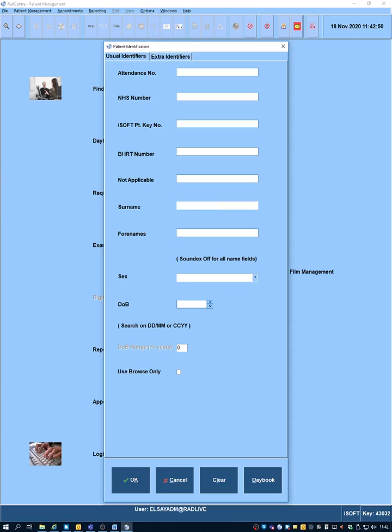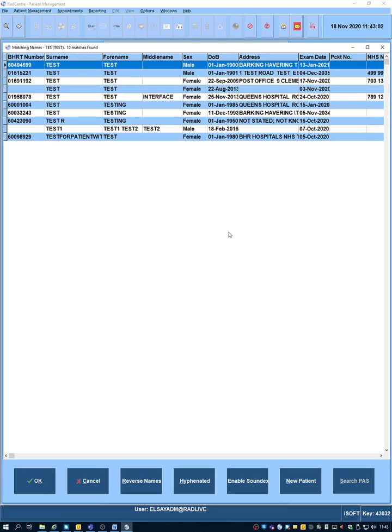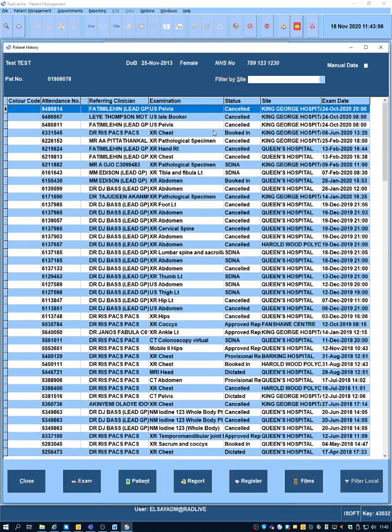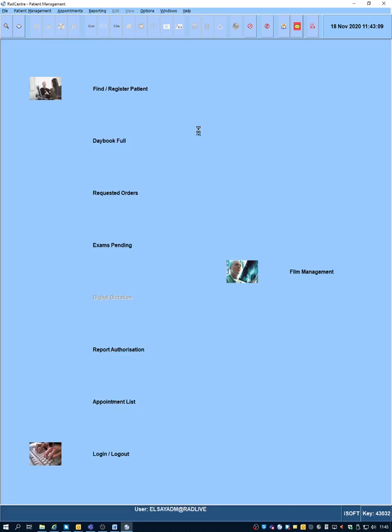I'm going to use a test patient name so that we can use this as an example. It's not the quickest system, so you just have to bear with this. It takes only a couple of seconds until it goes to the patient you're requesting. Choose anyone. I'm going to choose anyone here. For example, this is ultrasound pelvis, but let's assume this is a CT scan.